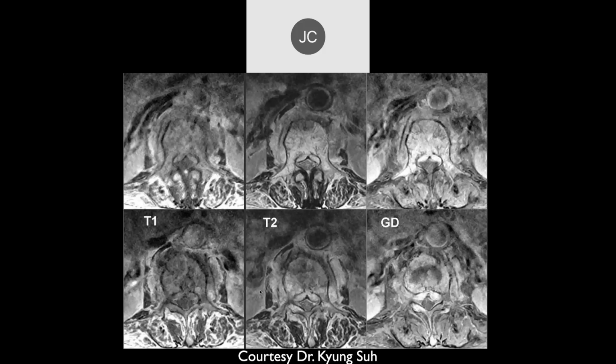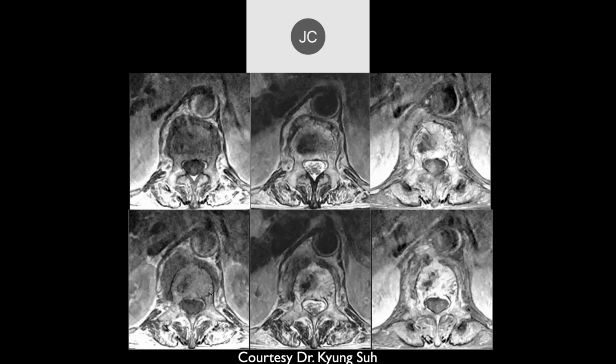In my practice and over the years, I saw a lot of backs and not that many infections, but it usually was just 1 disc involved. So it should be picked up really early. Here we're looking at multiple discs. Here we can see a lot of surrounding soft tissues. Here we can see more.